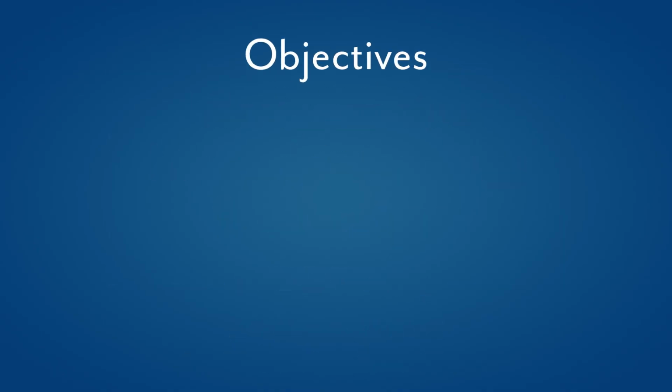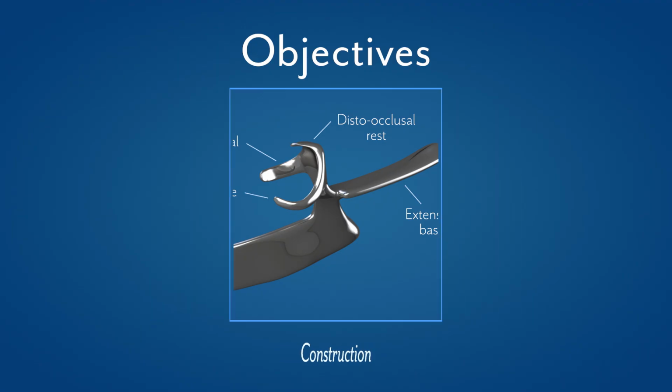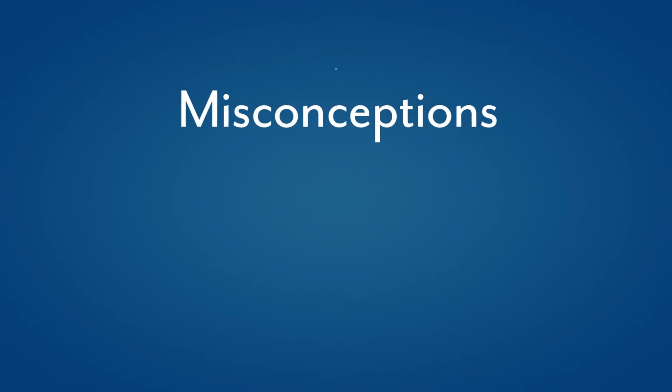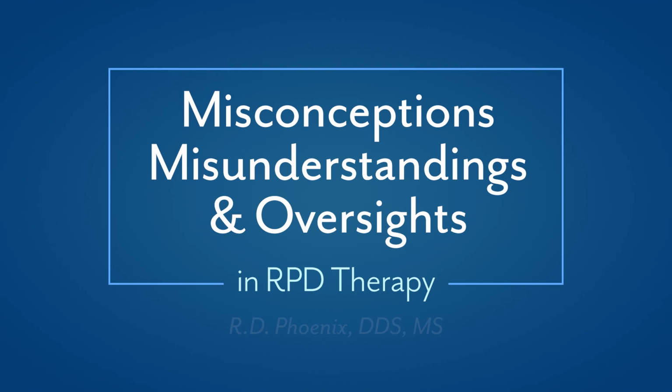This presentation is intended to describe the construction of commonly used RPD clasping systems, to explain the proposed mechanics of those systems, and to address common misconceptions, misunderstandings, and oversights in RPD therapy.